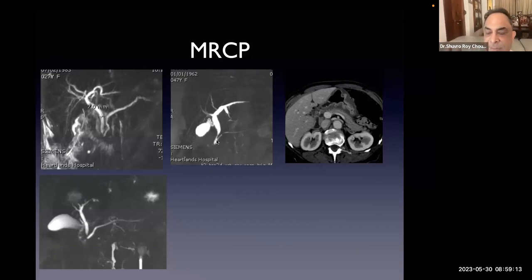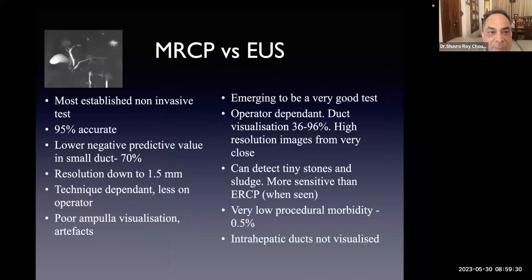This is the classic appearance in pancreatitis, acute or chronic, where the pancreatic head is edematous, and you see this sort of smooth, non-shouldered, benign-looking stricture. Okay. We have talked about these things.